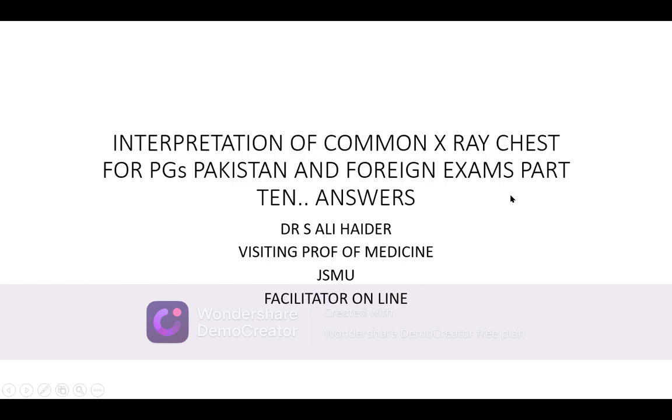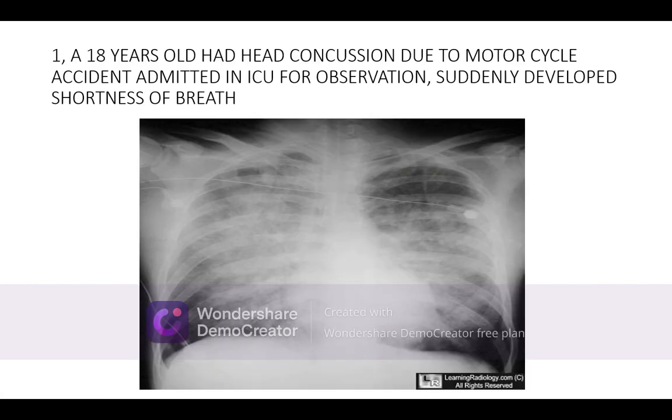So I've given you 5 questions as a quiz form, and then I'll try to answer or report these X-rays within a limited time. I'll try to do it, because time management is my problem. This is part 10 answers.